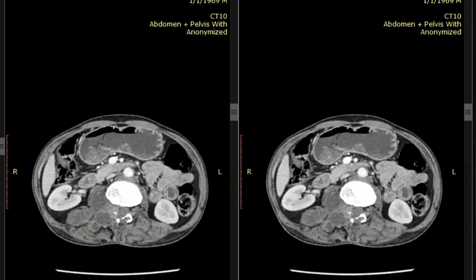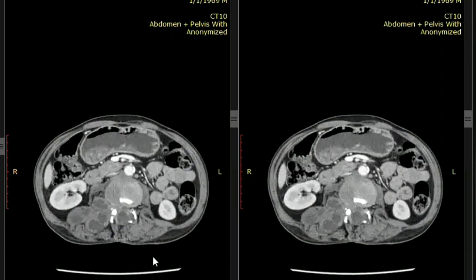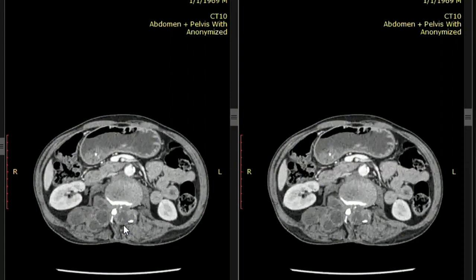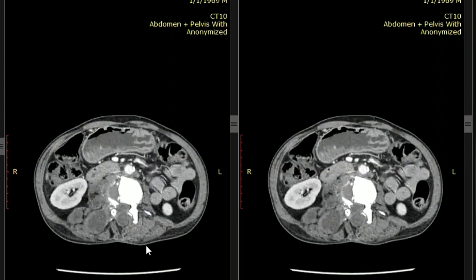Is this a known feature of hydatid? No, this is not a known feature, but if the patient is from Afghanistan and cannot come for treatment and harbors the disease for a very long duration, it can go anywhere. It can even extend into the entire skeleton. I remember a poster from RSNA where it was present in every single organ. And yes, you are right, this is a very crucial finding to mention, that it is extending into the spinal canal. You will go for the MRI to assess the spinal cord compression, and the neurosurgeon will remove this area to decompress the cord.